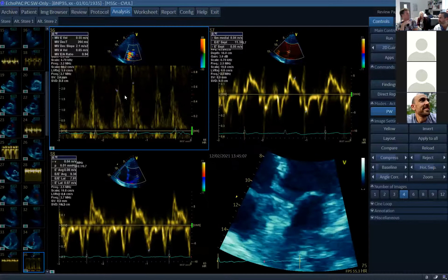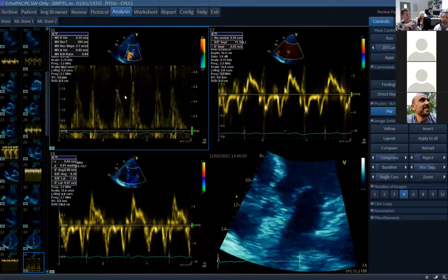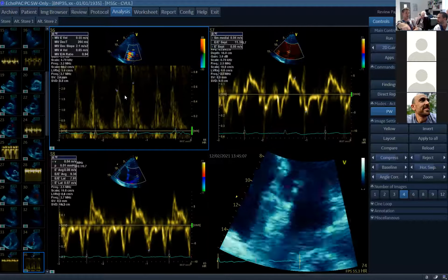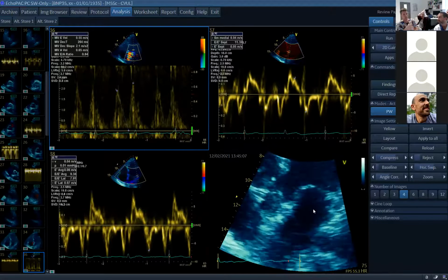There's got to be a source of infection. Very nice. There's got to be presumed infection there. And then often they talk about having normal left atrial pressures. So this guy's starting to fit a lot. In acute, that's the septic cardiomyopathy. And that's why we've got this normal left atrial size. Again, that's starting to point me towards thinking that this is acute.